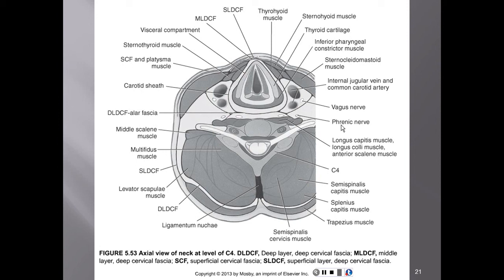And the phrenic nerve is in the compartment right behind it.